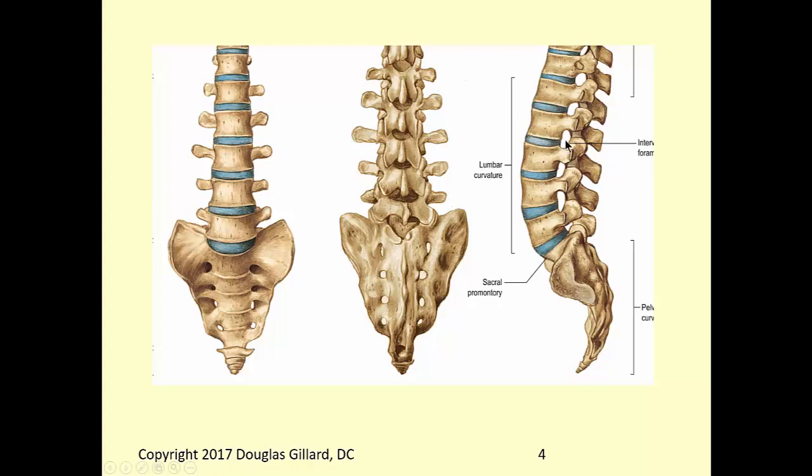Lateral view. Is this the right or left neuroforamen, also known as the intervertebral foramen? It's both of them. We can't tell. It's shot straight through.